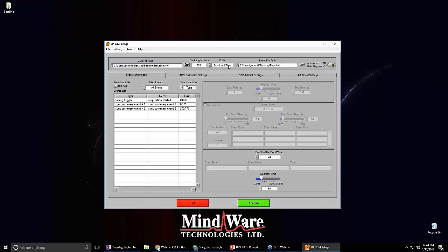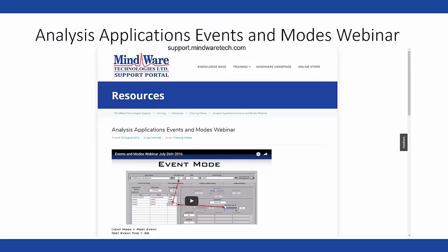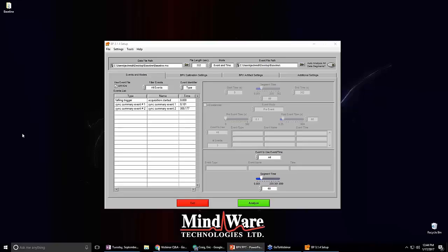If you need any additional clarification or help on those different modes, you can check out this article here. It's a webinar that we did back in August. I actually did it myself. This is the Applications, Events, and Modes webinar, and that'll walk you through every different way you could look at the data. But for today, we're just going to look at it in time mode, and we're going to look at 60 seconds here.